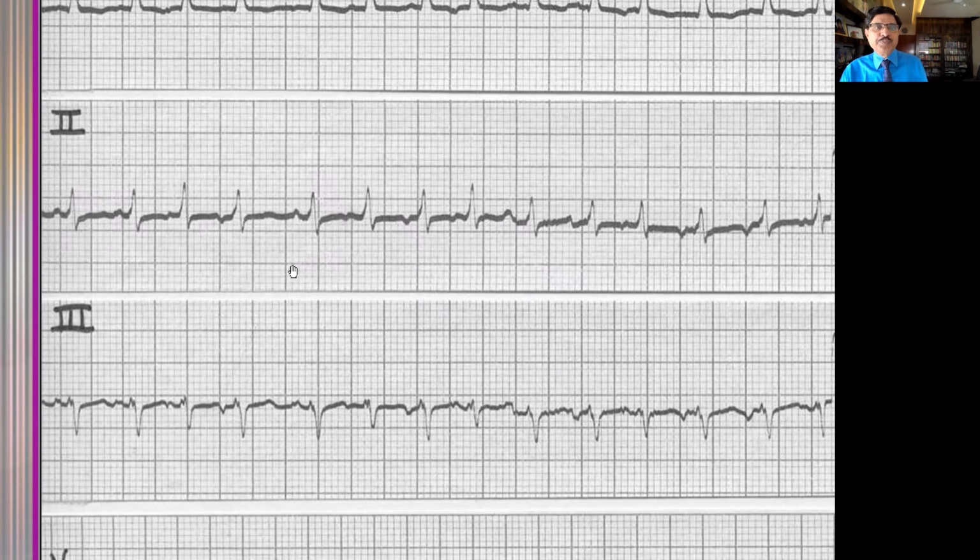That's what we did. Now 3 conditions have to be satisfied. Number 1, multimorphic P waves. We have that. Second thing is irregular QRS. That also we have got. And the third important thing is the atrial rate should be between 100 and 250. That's what it is there. If it is less than that, it is called atrial rhythm. So when does this occur? Whenever there is atrial stretch, particularly right atrial stretch, and right atrial excitability is more. And there are no F waves here. That is why even though it is irregular, we can't call it atrial fibrillation. We are able to see typical P waves. In case of atrial fibrillation, we don't see that.